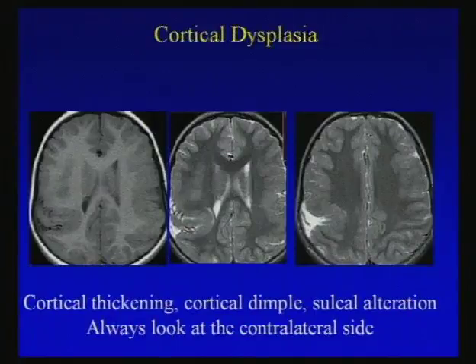So it's also been demonstrated that patients with cortical abnormalities frequently have abnormal venous drainage associated with them. And it's really important that when you find one lesion, to always look at the contralateral brain. Because as you see in this case, there's an abnormal, fairly large area of thickening in the contralateral hemisphere in multifocal regions.